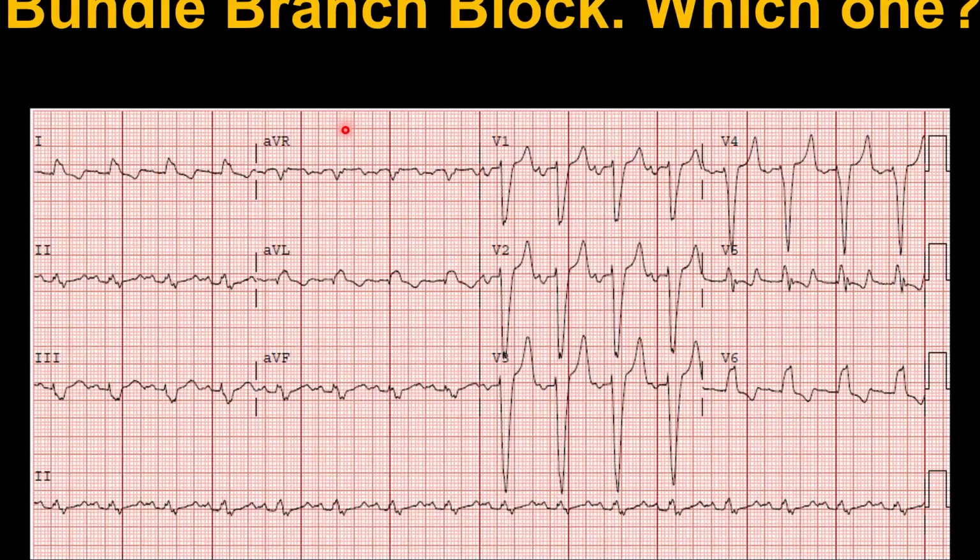Okay, here's another one. Wide QRS complex, negative in V1. And so is this right or left bundle? Marianne says left, and she's correct. I didn't want to say "she's right" because it's left. She is correct.